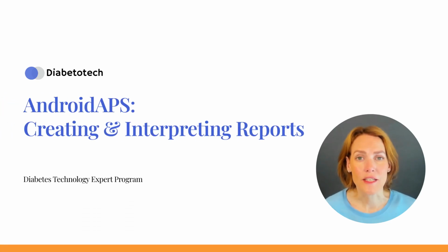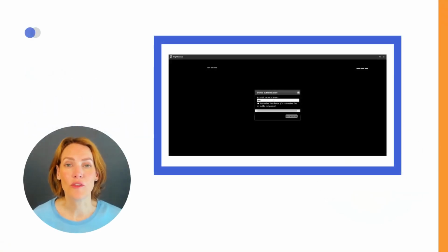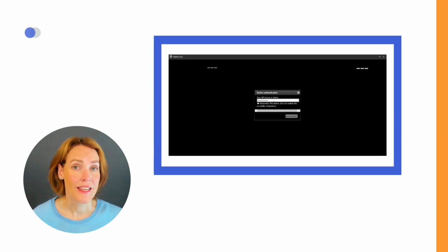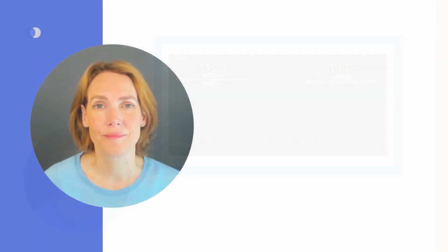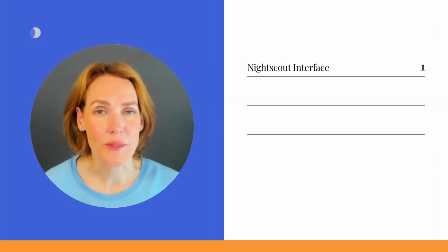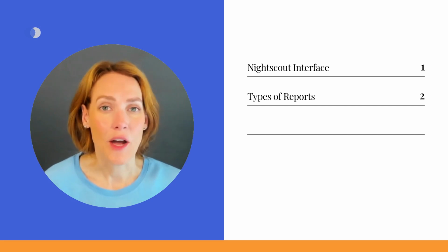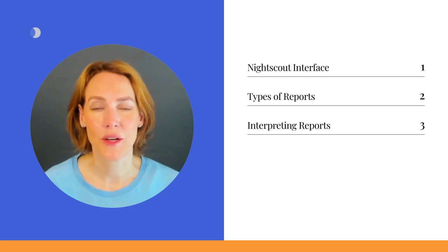In this video, we will explore the process of creating and interpreting reports in Nightscout, which is used in conjunction with AndroidAPS. Previous videos have covered the steps to create a Nightscout website and connect your AndroidAPS app to Nightscout for data transmission every 5 minutes. Now, we will delve into the features and functionality of the Nightscout interface and reports, helping you understand and leverage the valuable information they provide for managing your diabetes.